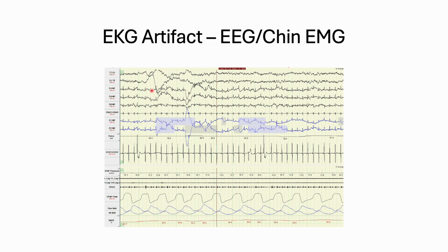This could be sweat, or it could be electrode popping, but this definitely looks like eye movements. This happens before the eye movement, so I don't think that's what that is. But this happens right there. It's artifact. That's the main takeaway. The thing about artifact is, if there is a chance that this is not real, then I wouldn't give it much credit towards being real.